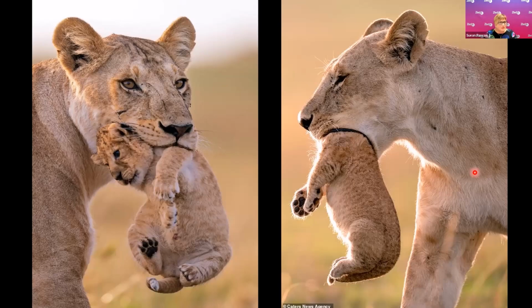Now, this lion, if you just looked at the picture on the right, you would think that she was eating her baby. But when we scan in the other plane, we can see that she's just holding the cub by its neck. And so that's the same sort of effect when we're scanning in ultrasound. We need to scan in both planes to build up a three-dimensional picture of the object.